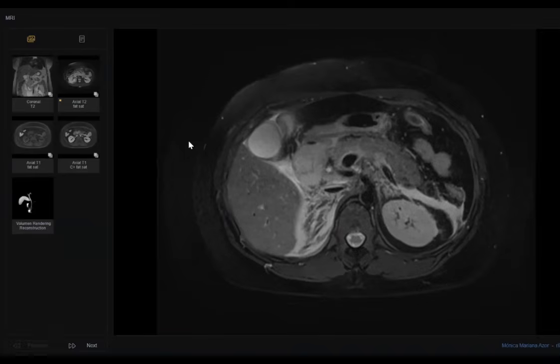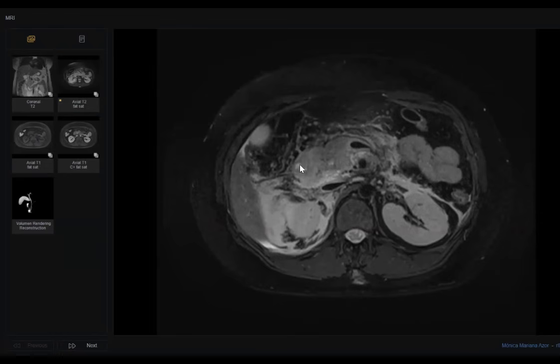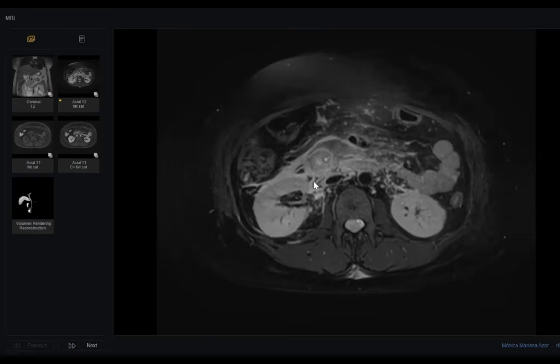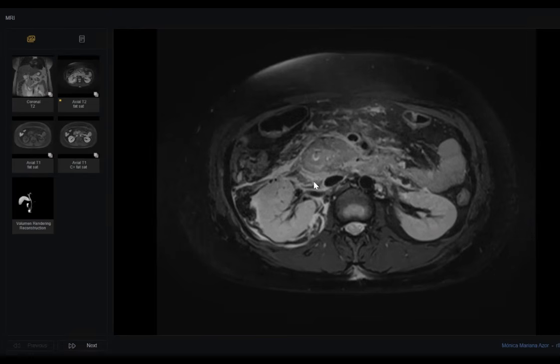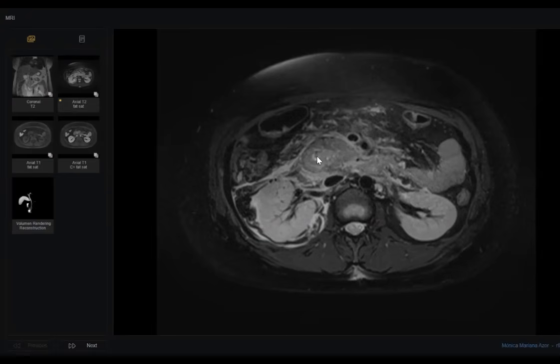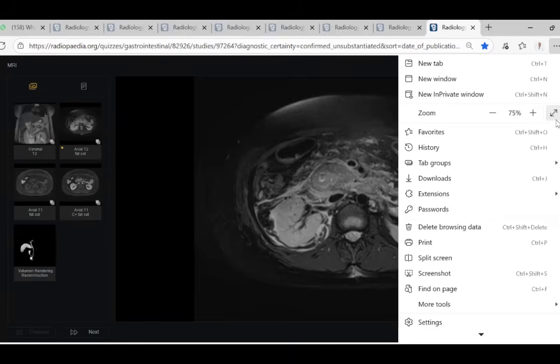Doctor, follow with me the duodenum. This is the duodenum. What happened here? It is swollen and edematous. See, this is the duodenum. What is the name of the structure that's surrounding the duodenum? Annular pancreas. Okay. So in T2, it is better to rule out or to prove diseases related to the sequence.